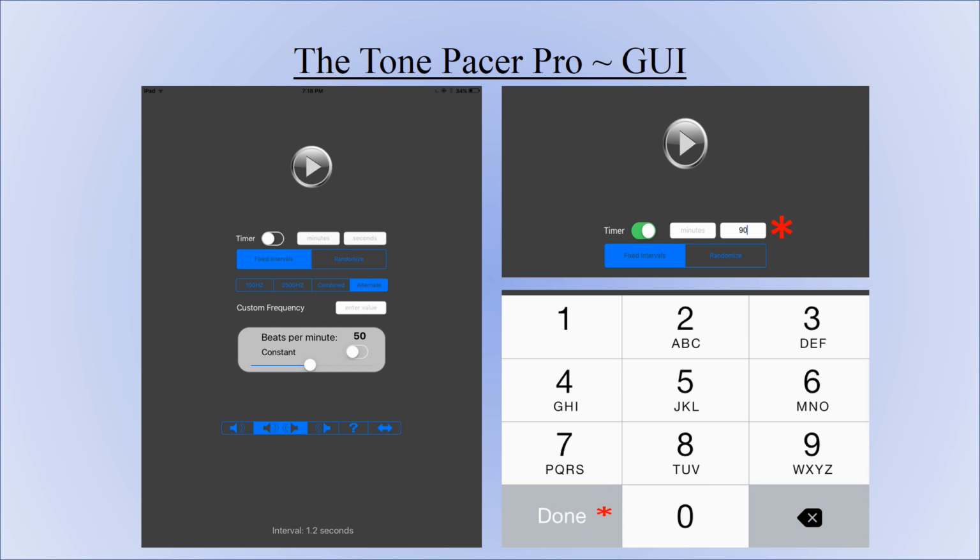Here you see the number 90 entered in the seconds field by the red asterisk. And you tap the Done button, which should close your keypad. And this sets your timer. If you want to disable the timer, just slide the button from right to left so it's not enabled, as seen on the left picture here on our slide.